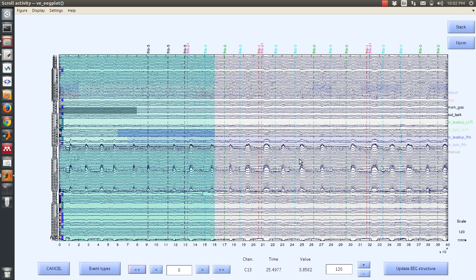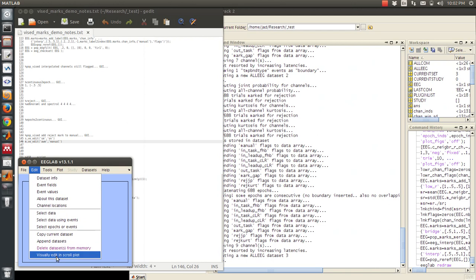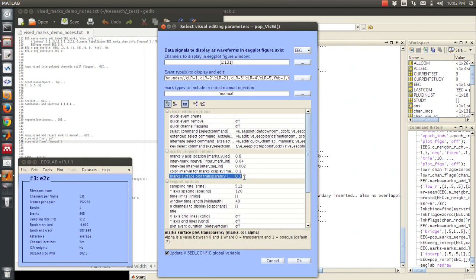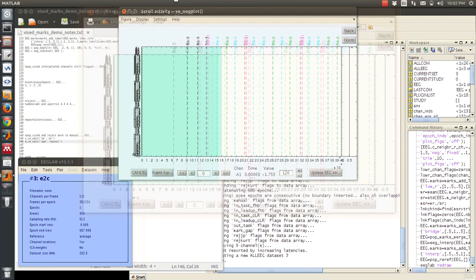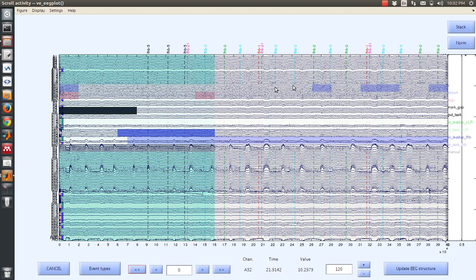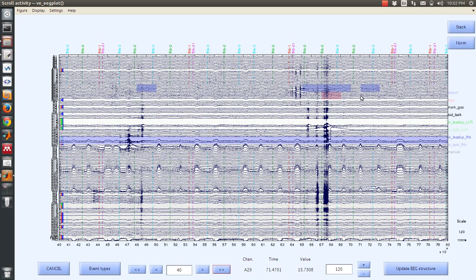So here we have the annotations, and actually I'm just going to close this, redo it, and put the alpha back up so that we can see the time marks better again. So I'll put this up to 0.8 so that we can see them clearly. So we can see now that these annotations here correspond to the windows that were flagged bad.